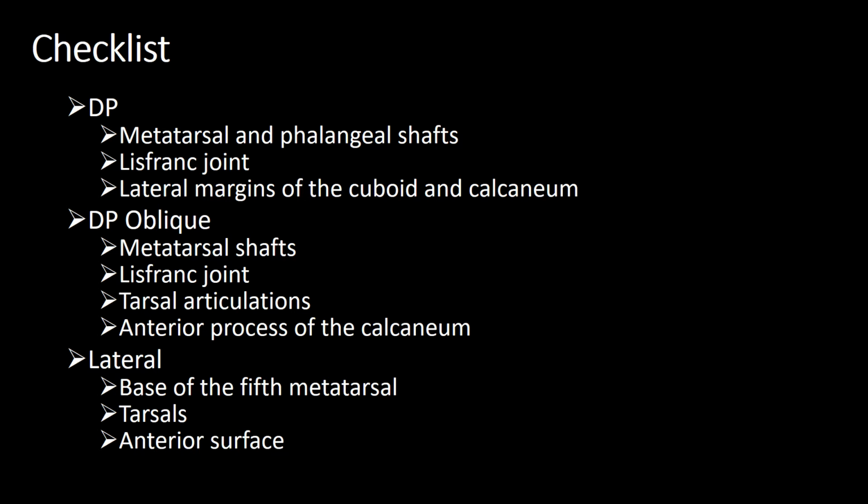So when you do a lateral image, check the base of your fifth metatarsal, check your tarsal bones, and check the anterior surface in particular of the tarsals.